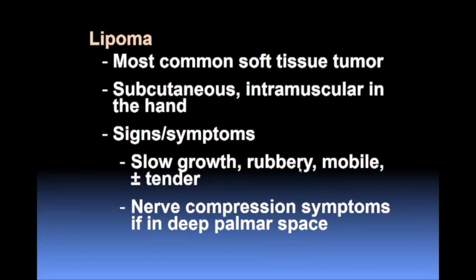Lipomas are very common. I swear some days I see half a dozen all over the body. It just seems to be the most common lump and bump that we see. I'm not sure why clinicians can't sort this out, even when they're squishy and they've been there for 10 years and they're not growing, they still get an ultrasound, but at least it's quick, it's cheap, and I don't think we're costing the government too much money diagnosing all these hundreds of lipomas.